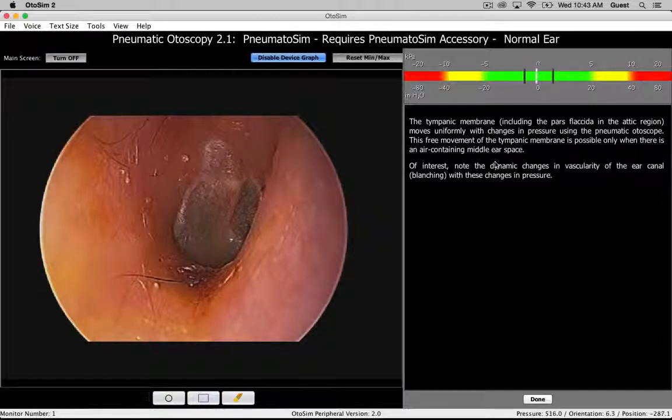And you can see on the top graph, the maximum pressures are actually stored by those two black bars on each side. So if I increase the pressure, for example, I can push the pressure into the red, which we don't want to do, obviously.